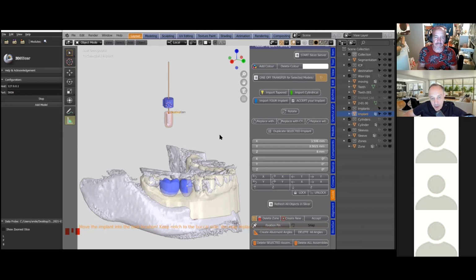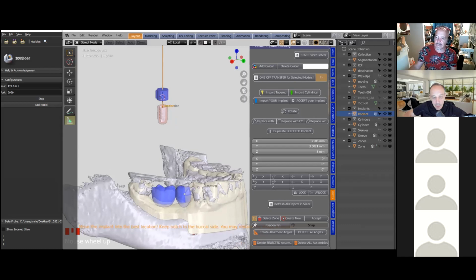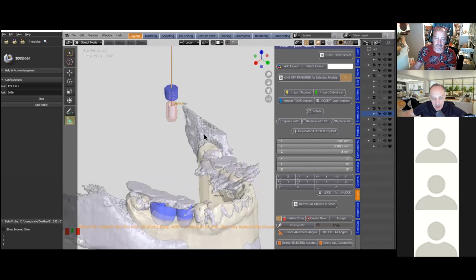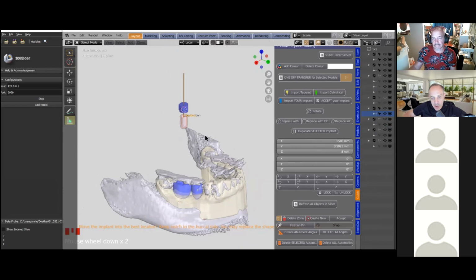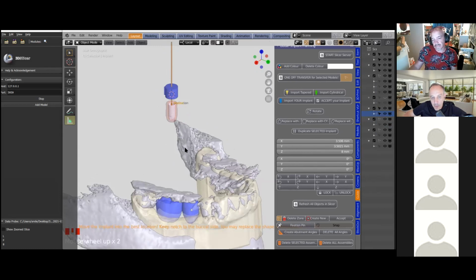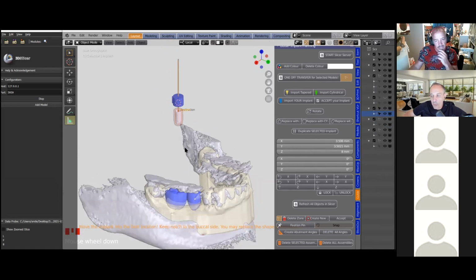Some of the components need a bit of adjusting, where if we're making an implant model, we are given the mesh geometry of the hole, and we actually have to convert that into an object first. But the video will guide you how you can include your own implant components, if you can get those in an STL file format or even OBJ file format.